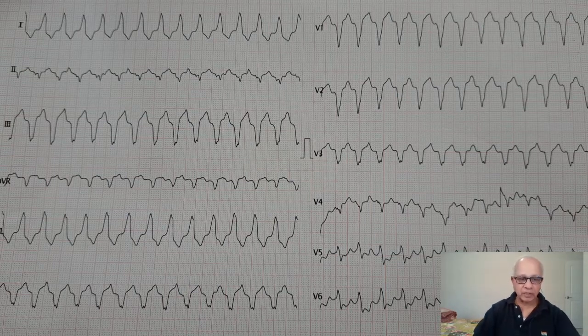So friends, I gave you a little extra time. I'm sure you would have made a diagnosis, isn't it? Anyhow, we'll go on to the discussion of this ECG. Now this discussion of the ECG is going to take a little longer time than most of my other discussions. So we'll start off here.